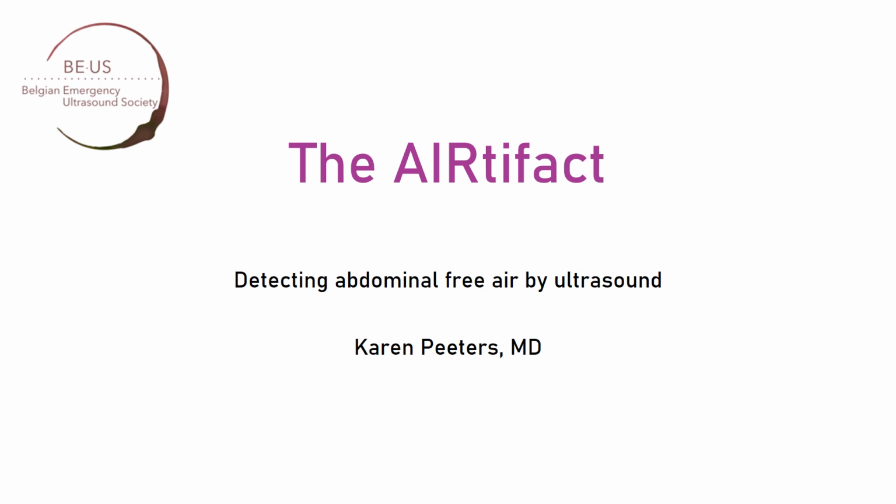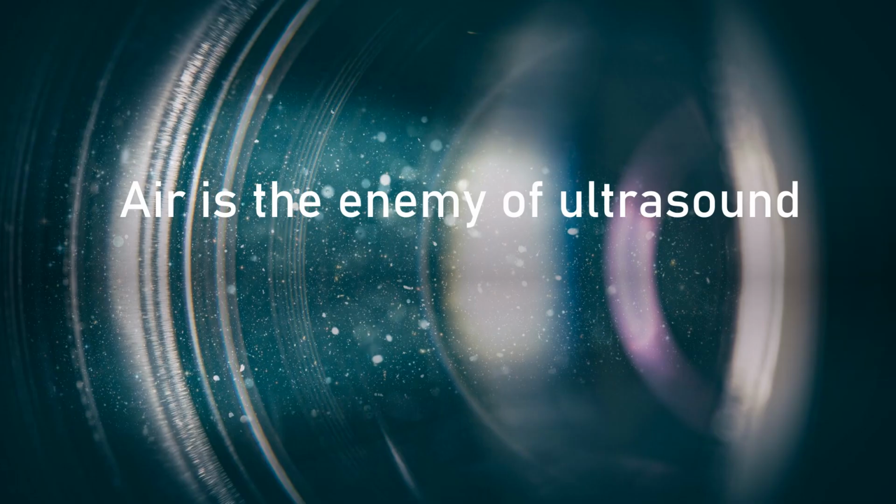We'll be talking about ultrasound and air, in particular detecting abdominal free air by ultrasound. We all have experienced this. You managed a beautiful view on the heart and suddenly there is the enemy. Some air is coming in front and the picture fades away and the heart is just gone.